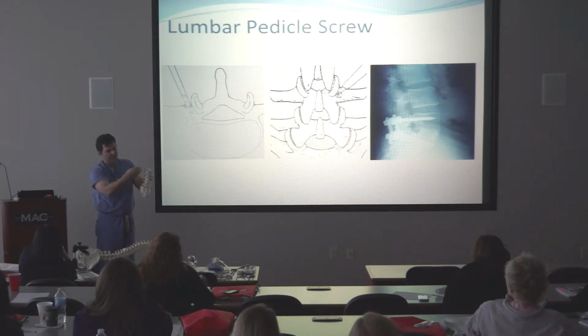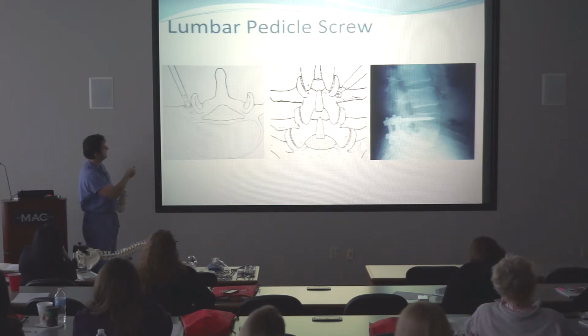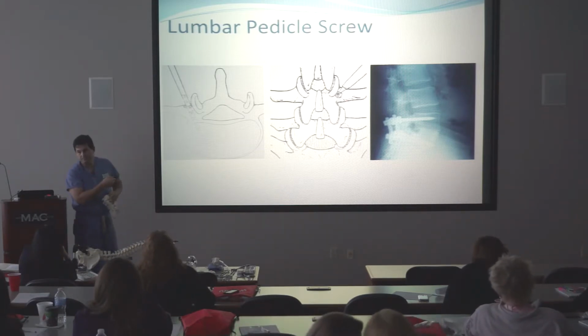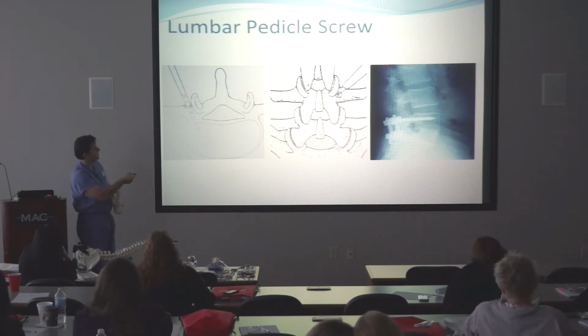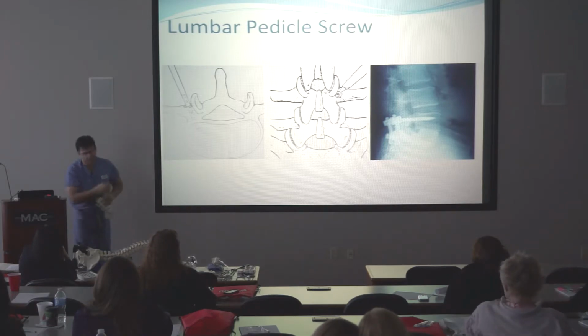And then which level you're at depends on which angle the screw goes in, whether it goes in straight, goes down a little bit, or angles up, depending on the orientation of the bone in the spine. Okay, but that's how we do it using a probe. That would be for fusion. This would be pedicle screws where you'd put 2 screws on each side. So there'll be a screw right where this little awl is going in, one here. There's a rod that will connect those two, and then a screw here, and a rod that will connect those two. All right.